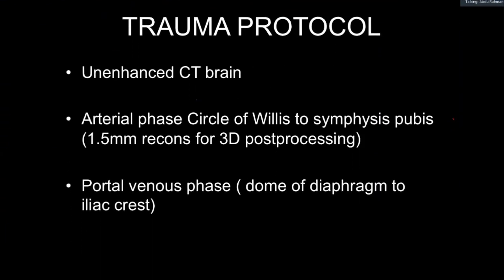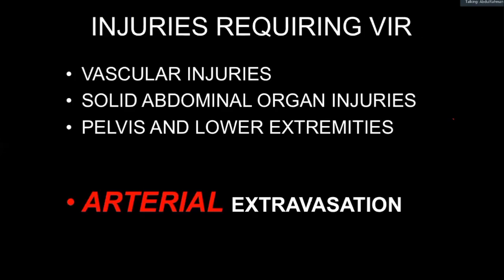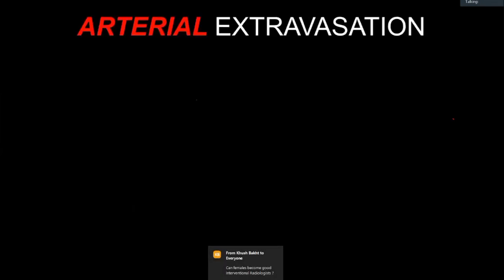Trauma protocol that is used in major trauma centers. I can't remember why I was showing you this. Oh yes, okay. So interventional radiologists. Now this is just to show you what is arterial extravasation, how to differentiate between the two. Arterial extravasation is the only reason why I will get out of bed and do something about this patient.